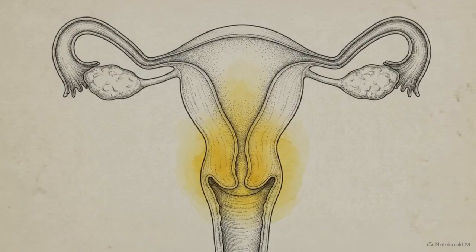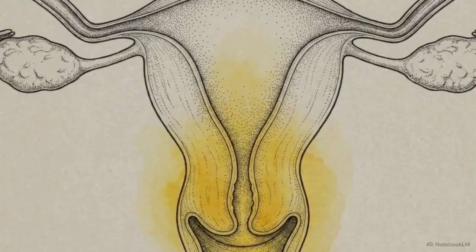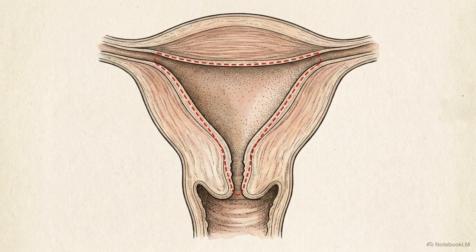The diagnostic focus now incorporates maternal anatomy. Through transvaginal measurement of the cervix, we establish a clinical predictor for the risk of preterm labor. This rendering demonstrates the pathological threshold. The cervical length here measures below 25 millimeters. You can also see funneling, where the internal opening of the cervix is beginning to dilate from the inside out.